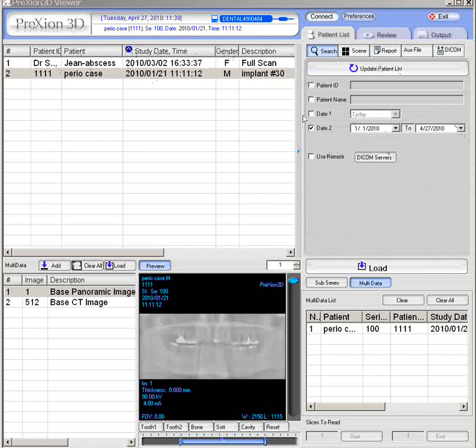that you wish to survey. We could have done it by patient name. Type the patient name, hit update list, or patient ID, which would be this number here, and hit update patient list. It gives you only those patients that you want to see in the list. Or you can uncheck all of this, hit update patient list, and you get the whole total number of patients that have been performed.